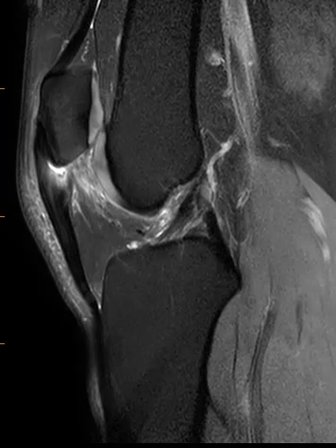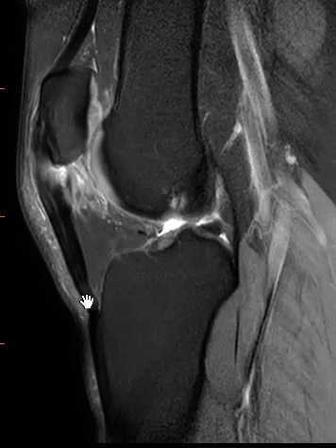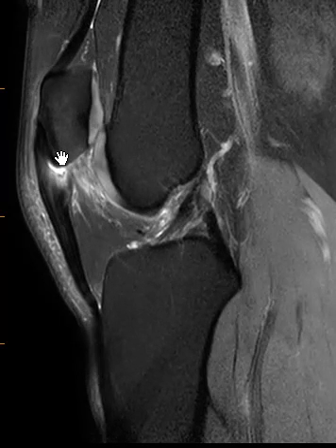Hello, this is Dr. Gay from First Look MRI, and this is a straightforward case of a jumper's knee in a 32-year-old male. He had an injury and now he has edema or fluid signal right at the periosteal interface between the patellar tendon and the mid-inferior pole of the patella.